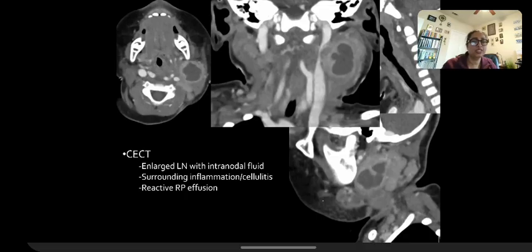And in this patient, you can also see that retropharyngeal effusion. Remember, we said that any kind of adjacent neck infection can cause a sympathetic effusion. So you can see that here in the middle image, where around the carotid vessels you can see that retropharyngeal edema or effusion. Just showing you, that yellow arrow is the retropharyngeal effusion, and then you can see the internal jugular vein is compressed, but there's no thrombophlebitis yet.